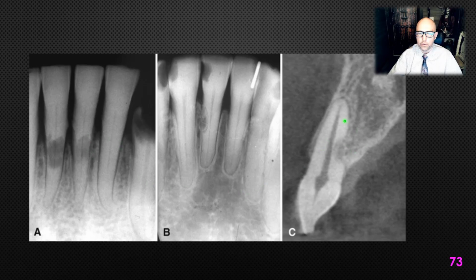This shows a 3D view. Now we're looking at that tooth from the side, so you're looking at more of a sagittal plane, a cross-sectional image of what looks like a maxillary incisor. And you can see from the palate this resorption and the PDL space remaining intact. And this looks like normal bone, so the bone just kind of invades from there.